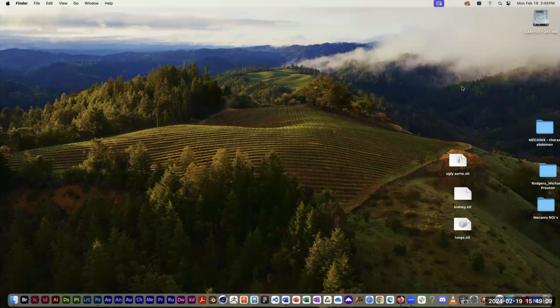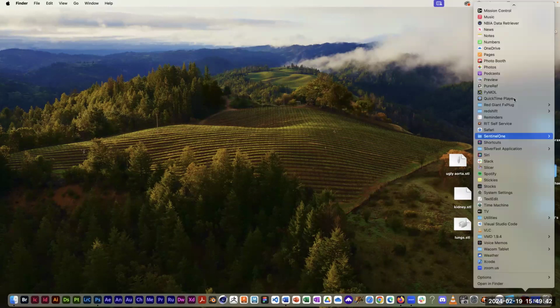So what I want you to actually do to hand in today is I want you to play around with these different methods of creating ROIs. We don't have a ton of time left. If everybody wants to just jump to the lungs because they're so cool, that's fine. But I want you to actually render one of these 3D models. We're going to just do a real quick and dirty render. We're not going to get involved with Maya or Cinema 4D or anything like that. We're actually going to use a program called MeshLab.